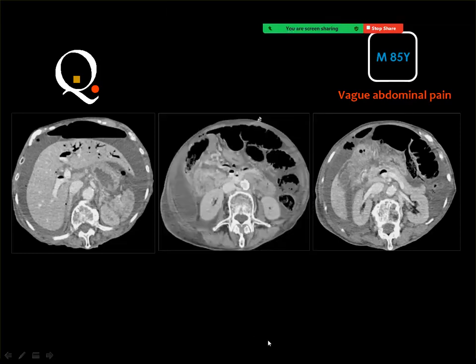There is pneumoperitoneum. Yes, and pneumobilia. These are the bile ducts, in the portal venous radicals. Portal vein, yeah. Mesenteric ischemia, doctor? Yes, and the answer is right.